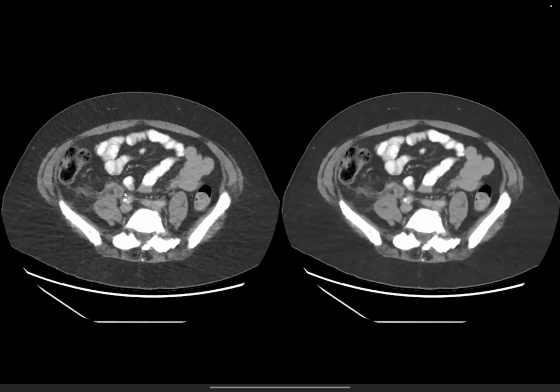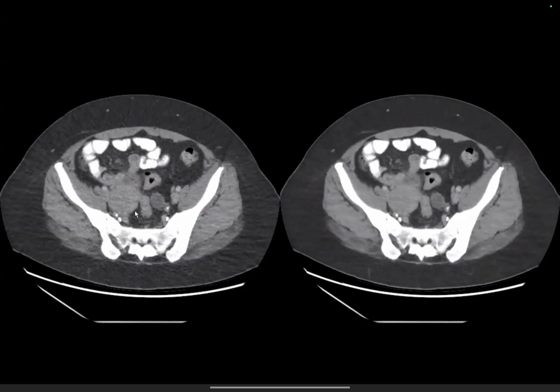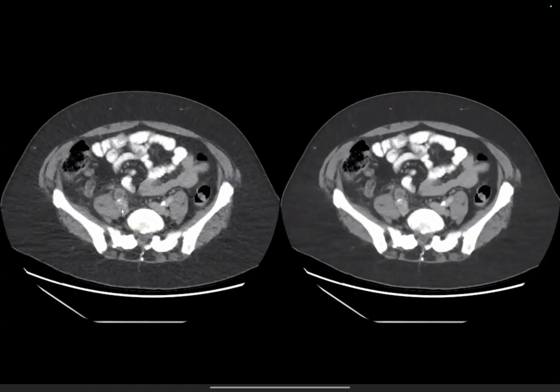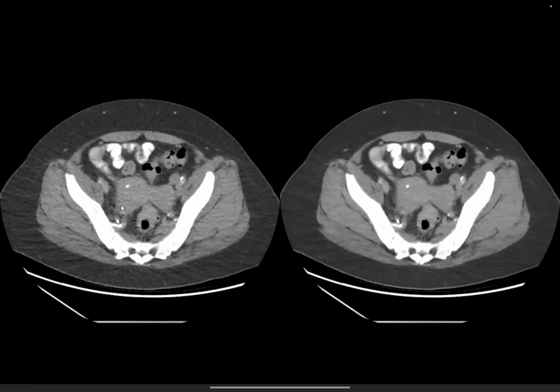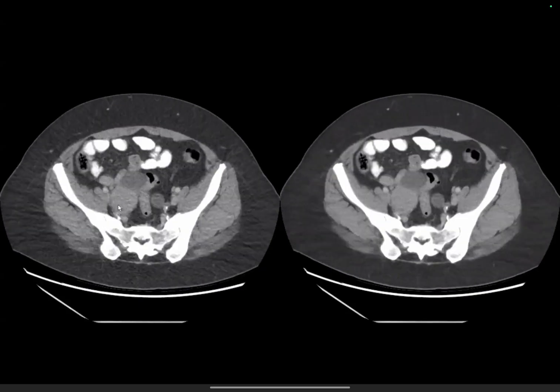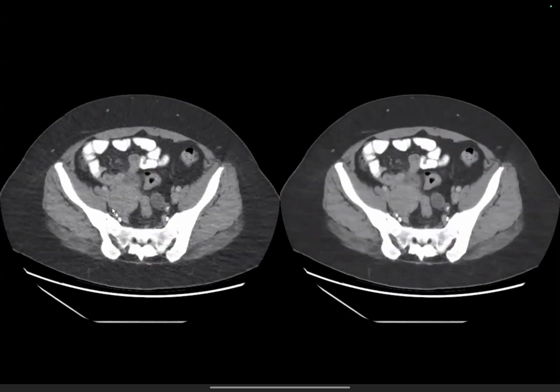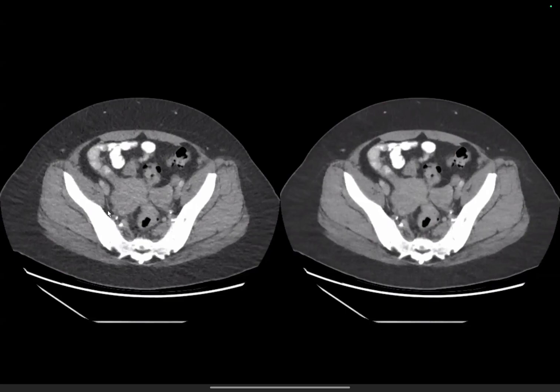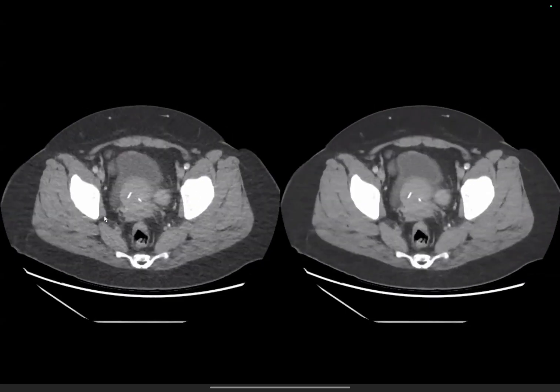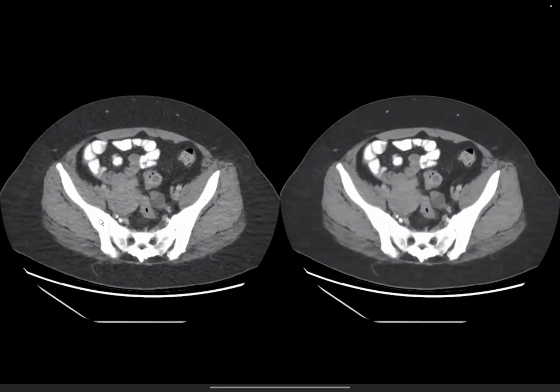That's good. So as you rightly said, there's also thickening. That's perfect. And what do you think is this? As you said, there appears to be an abrupt narrowing of the ureter, right? So what is this causing? There's a soft tissue density lesion, well-defined soft tissue density lesion with some foci of calcification. Go ahead, Upasna. That's excellent, Ishan. But Upasna, you were saying something.